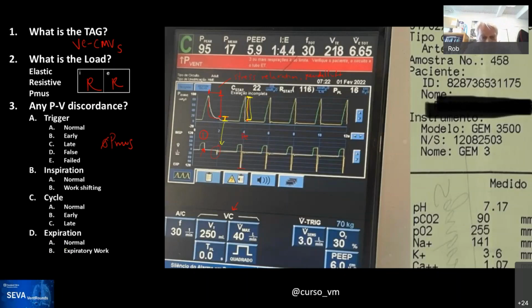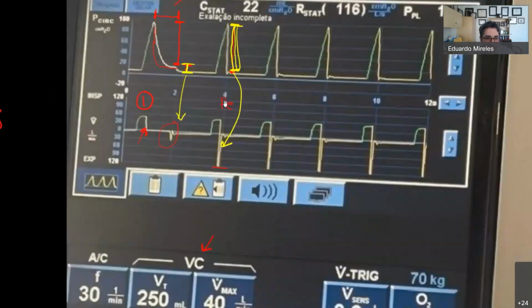That's your driving pressure. So whatever comes out is whatever volume is available to do that. So just remember the driving pressure is proportional to the peak expiratory flow. Yeah, I can zoom. There you go.